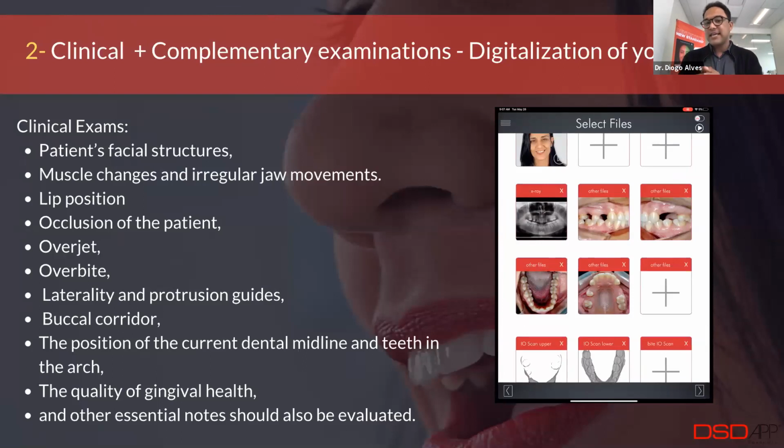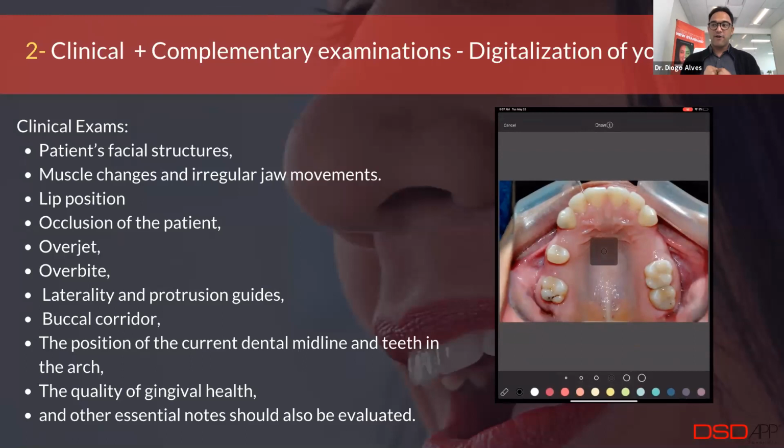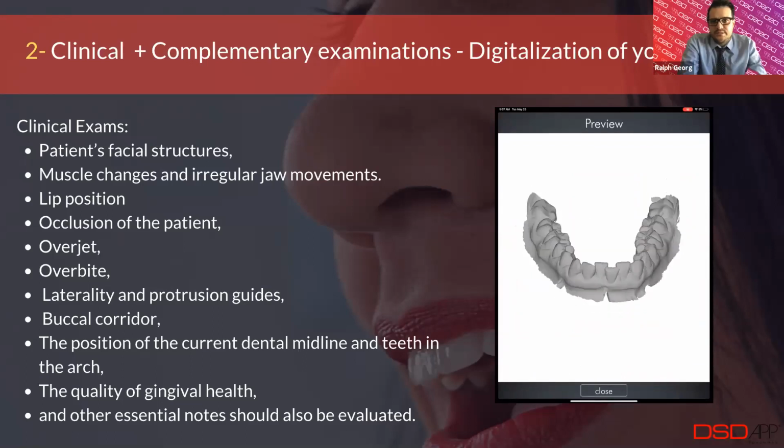One of the greatest things is that you don't just have those patients for yourself, because you can export all of those documents into one file and share that with your dental technician or with other specialists who are also working on the project. And you can add your notes into it, which is great.